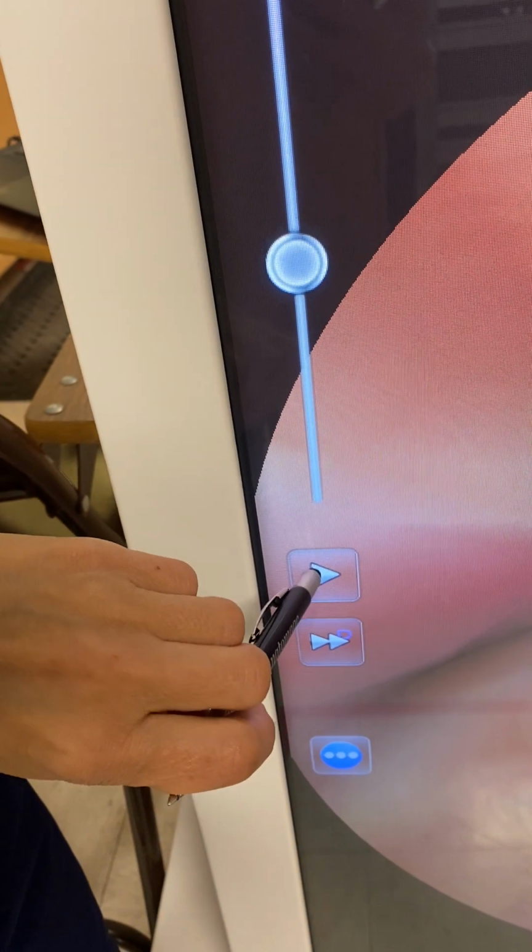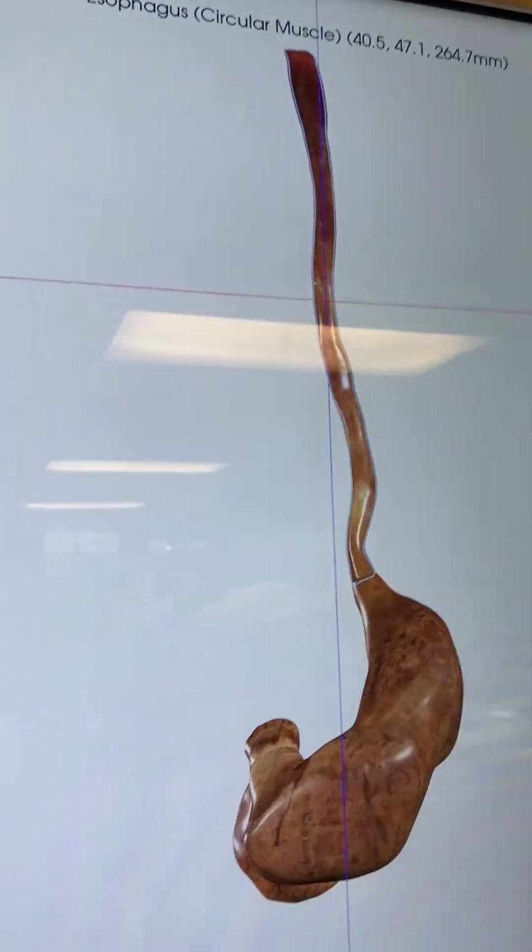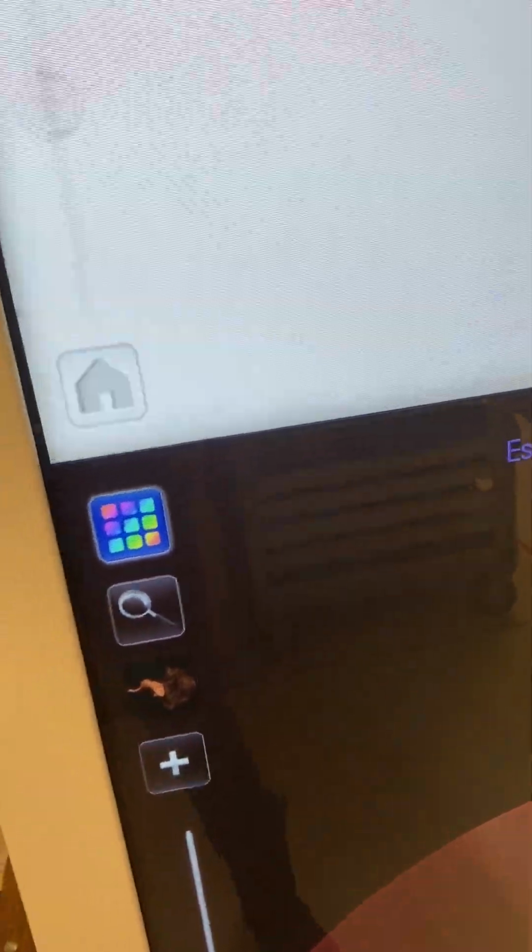Let me now change the direction of this video from this view to the other view. Now you remember this was coming down because I changed the direction. It's going to go up again, in a different direction. So when you turn it on, it's going to go up. It's very cool feature. You can work on it and see different parts.